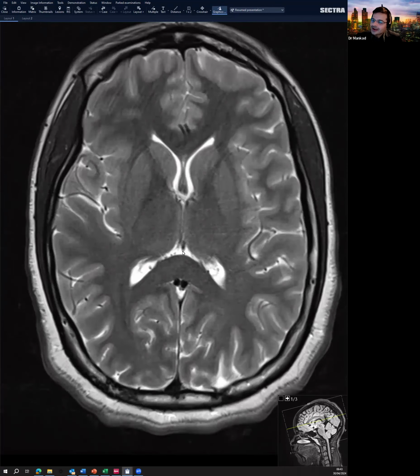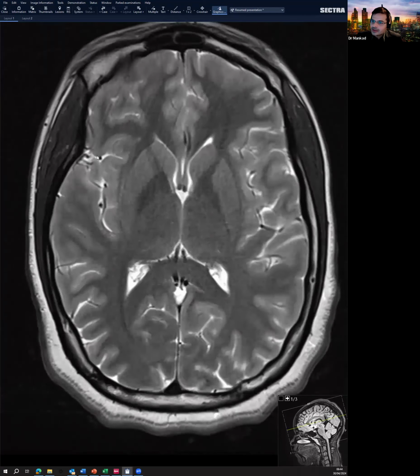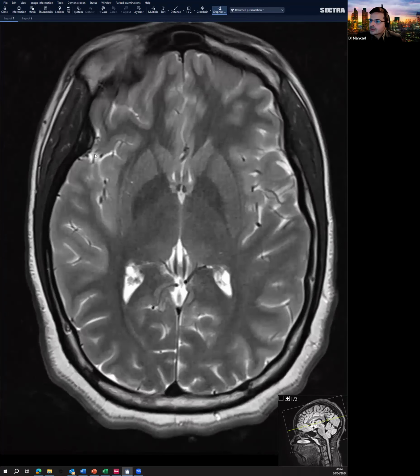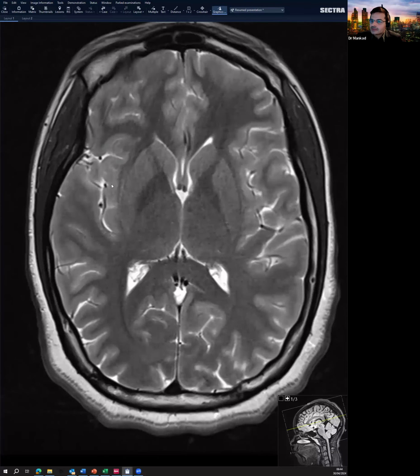So now we are somewhere in the middle of the brain on that axial. An important landmark is here again. Going from outside to inside, you have this structure here, which is the Sylvian region, and this is the Sylvian fissure. The Sylvian fissure is very important because around it you have the arrangement of the perisylvian cortex and the insula, and that separates the frontal lobe from the temporal lobe behind. These are clear demarcations. All lobes are not clearly demarcated, but these are very clear.